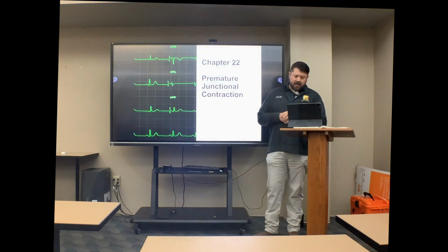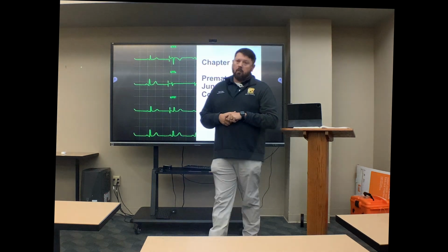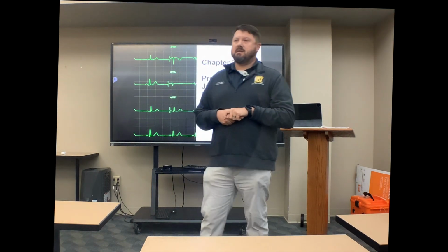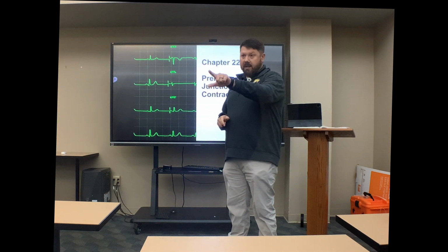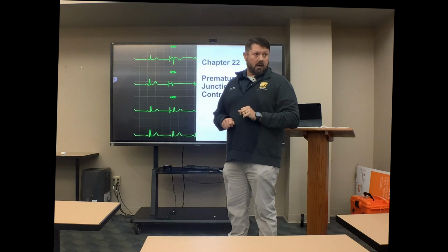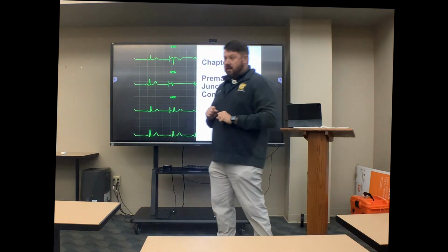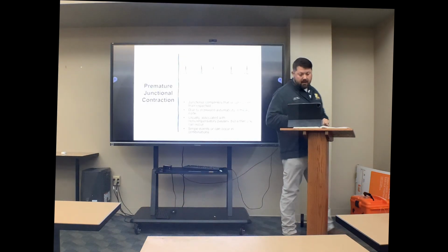But just taking a stab in the dark here from what we just talked about, what do you think we're going to see that's going to identify this as a PJC? No P wave, inverted P wave, or post-QRS P wave, but it looks different than your underlying rhythm, all right? These are usually easier to identify than a PAC is. Okay?